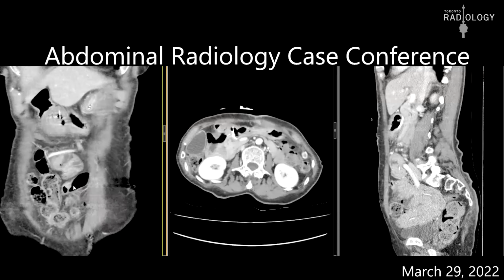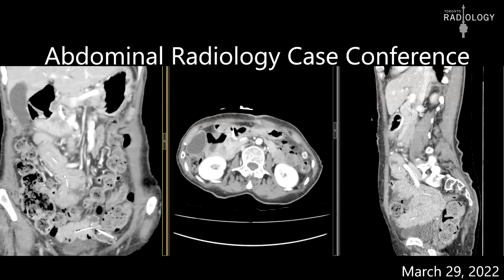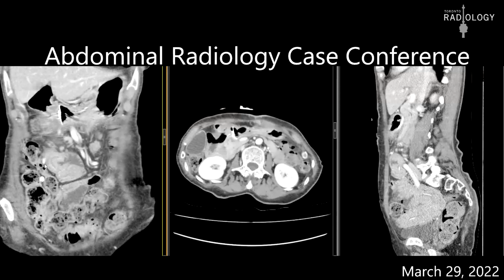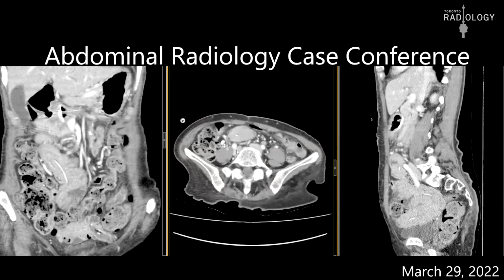So then what I did is that I looked at the product insert of the Duodopa tube as to what the possible complications involved in that are. Among the various complications mentioned is that, for some reason, the tip of the tube is more likely to have bezoar formation. And I'm like, okay, that's interesting. So let's just see what's happening at the tip of the tube here.